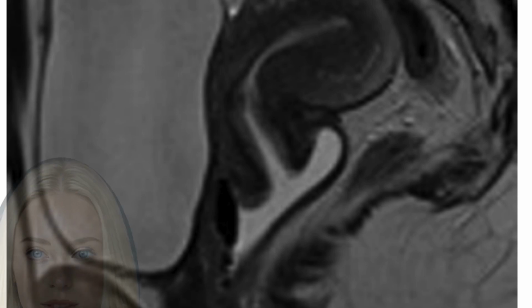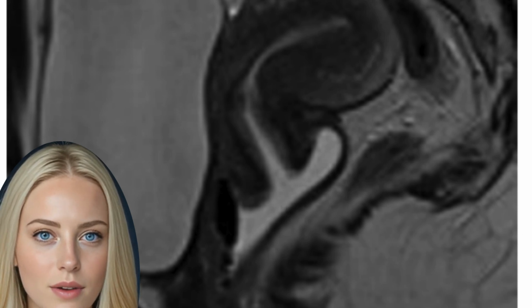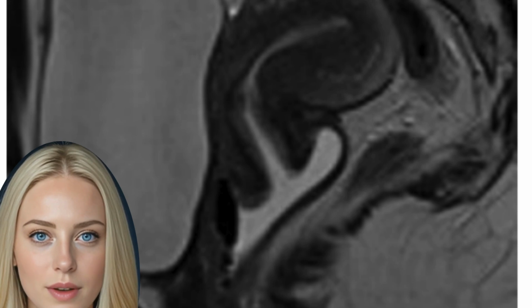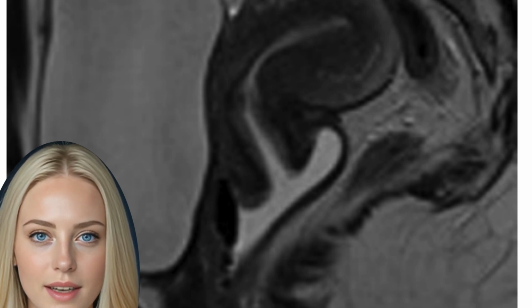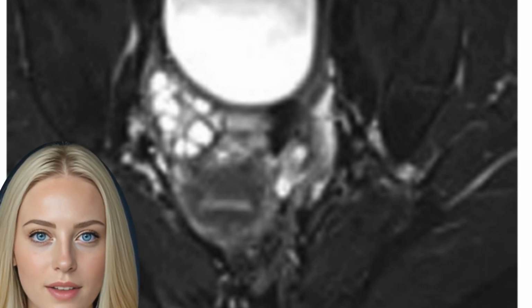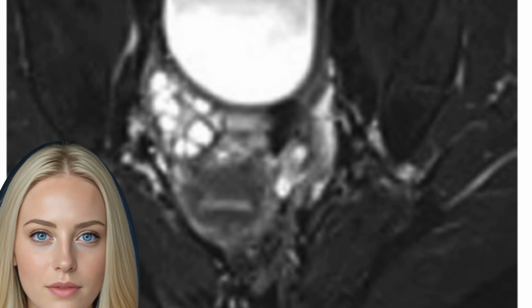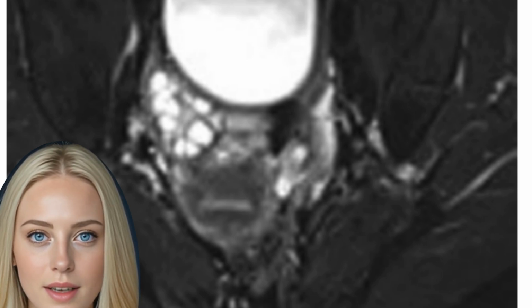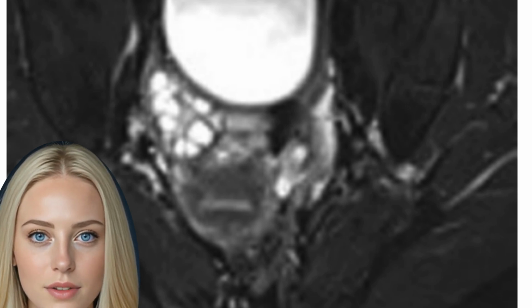In recent years, diffusion-weighted imaging, DWI, gains more attention. This imaging technique was designed to depict alterations in thermally induced random, Brownian motion of water molecules within tissues, and the degree of this motion is known as diffusion. DWI can be performed quickly, without the necessity of contrast IV. The technique yields qualitative and quantitative information about tissue cellularity and cellular membrane integrity.